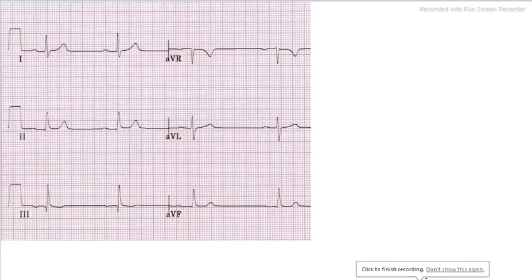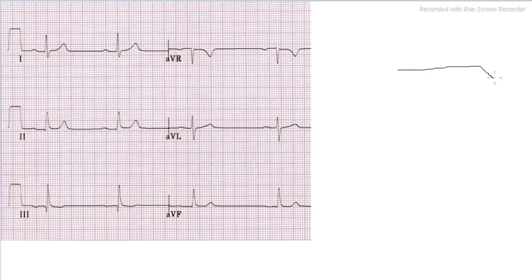Greetings to all. In this video, we will be discussing how to determine the axis in case of ECG. In the basic theory lecture, I have already discussed that if you want to find the axis, I most preferably use two leads, one is lead 1.